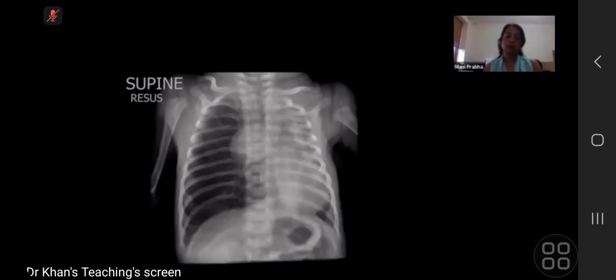As far as I can see, the right lung looks quite normal, and therefore I think that the primary pathology lies on the left rather than overinflation on the right. I'd be concerned for either plugging of one of the left main or lobar bronchi, or bronchial atresia.